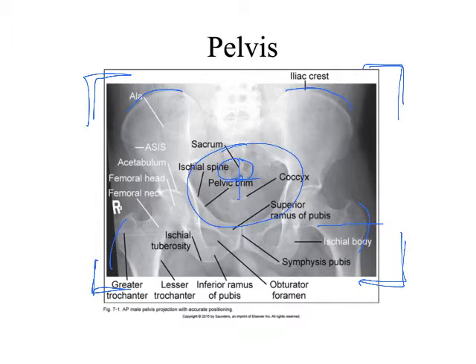If I answered no to any of those questions, then the centering must be off. Does that make sense? I've just reframed it. Contrast and density for this also are going to need to show some grayscale because we want to be able to evaluate the psoas muscles. We want to be able to see some of these joint spaces, right?